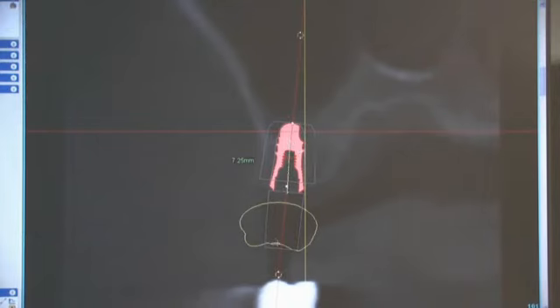And again, looking at the buccolingual with the facial being on the left side of the screen that we're looking at, right side of the screen being the lingual, we want the occlusal forces to be down the long axis of the implant. And again, having a wide ridge like this really gives us an advantage. Oftentimes when we lose a tooth, the bone will shrink towards the palate and will shrink up, so we don't have as much room. So the implants are necessarily placed more lingually or palatally, which can create some issues. We're going to get some cantilevering there. But in this situation, we really don't have that concern.